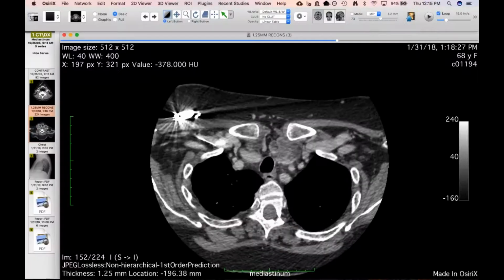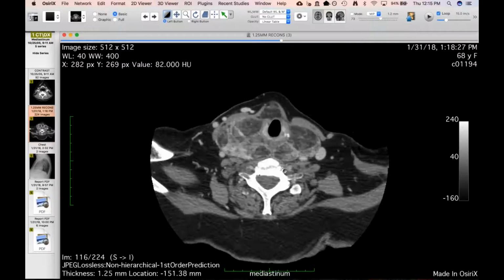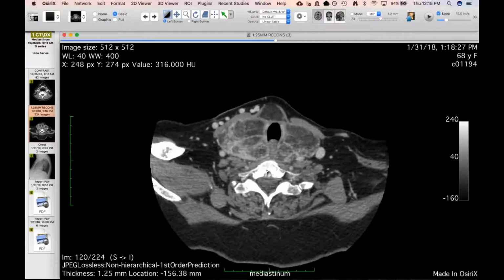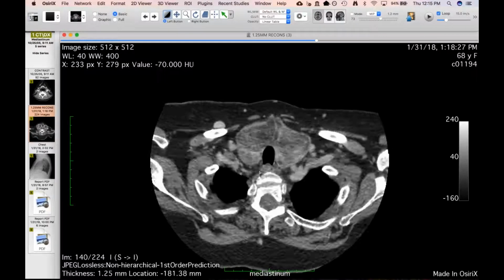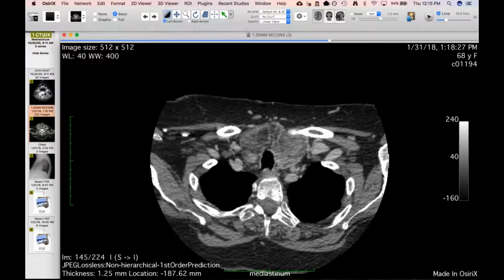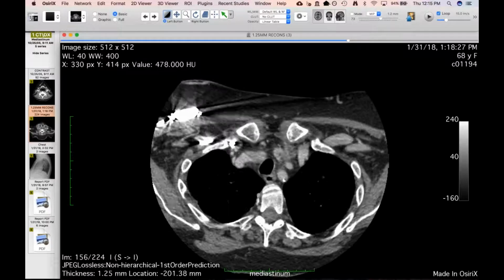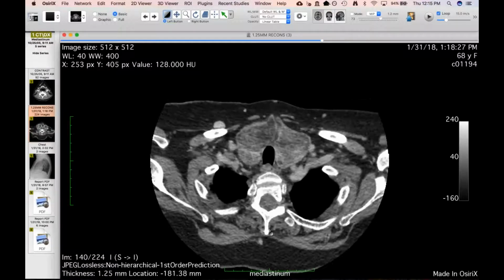But yeah, I'm calling this a case of thyroid lipomatosis. I don't have a better explanation for it, and it certainly doesn't look like a discrete tumor. Very strange. And it's just interesting that we happen to have a neck CT showing a normal thyroid 10 years earlier. So, David, any comment?